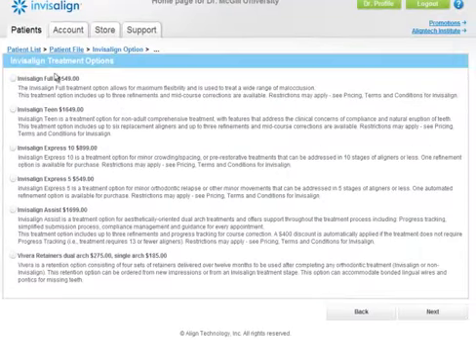So we usually in the clinic, we use this one, the full Invisalign. There is a teen, there is an express when you only have 10 trays, where they only move anterior teeth. This one is for 5 trays. I've never used it. I don't quite know what it's for. The assist is when you start, you see it's a treatment option. And again, aesthetically oriented dual arch treatments, so it's for simple cases. And you have 3 refinements. We'll see what refinements are later.